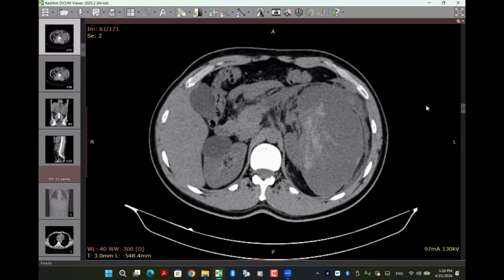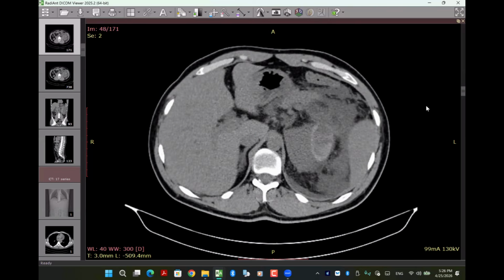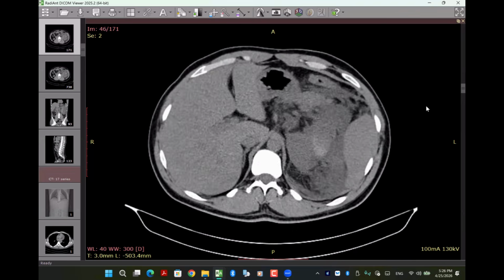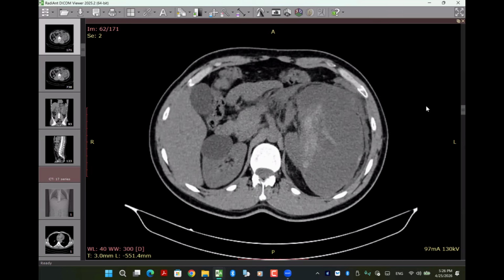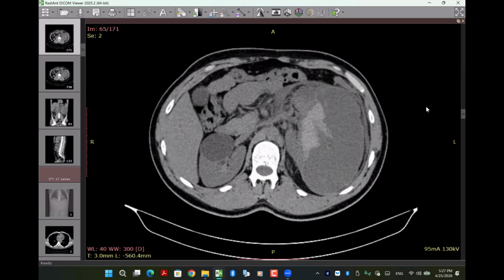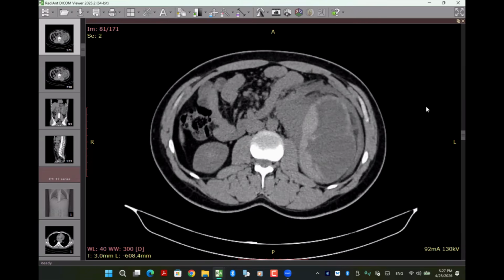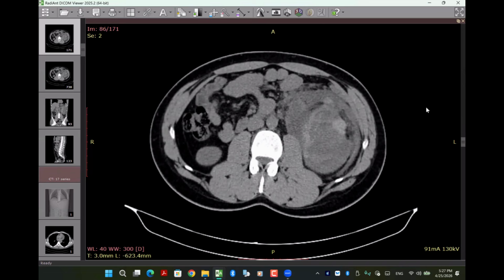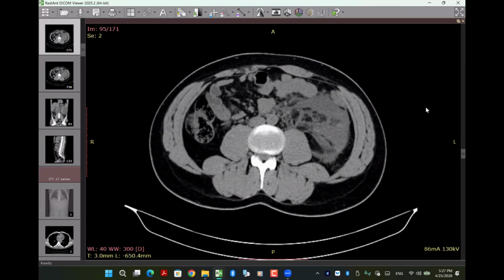Can you give me a diagnosis or differential diagnosis at this stage? So this high density represents the kidney, which appears to be displaced to the left side. These findings of a large loculated collection with high density could be urinoma, it could be hematoma. I could not see any congestion and thickening about the mesentery. Do you want to ask the clinician questions? I want to ask about any history of trauma.